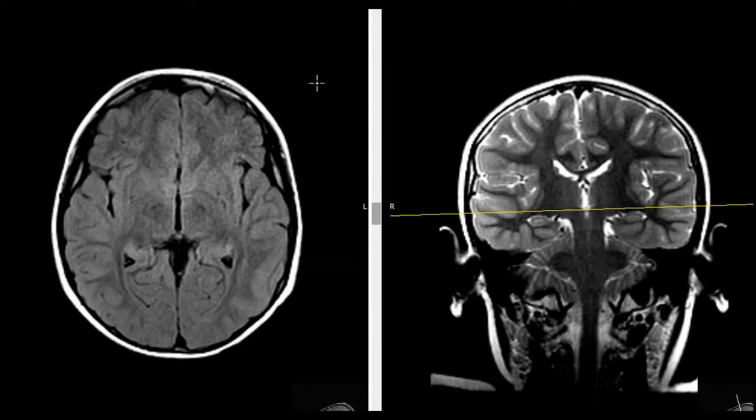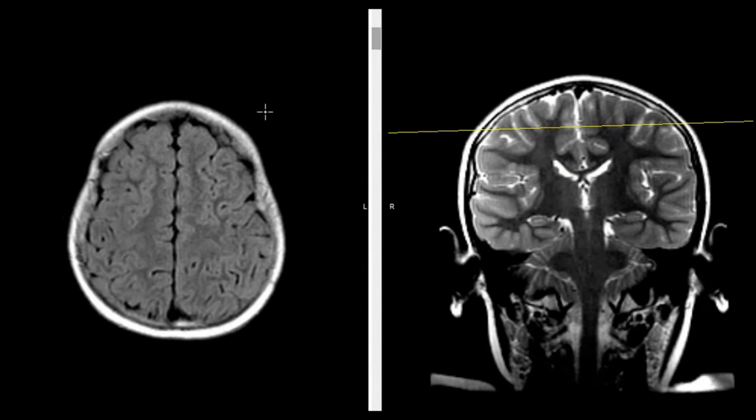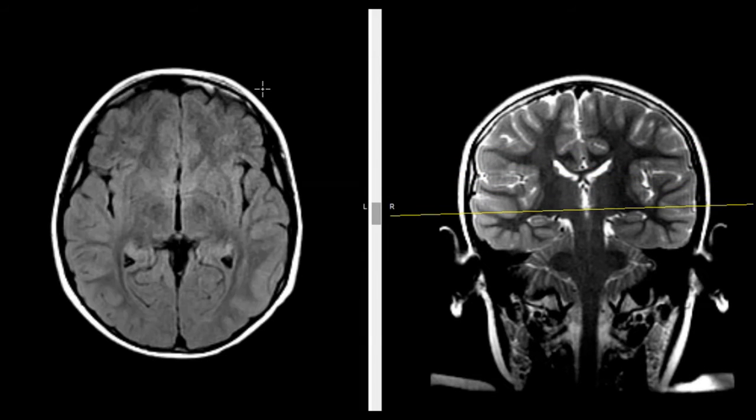This is a 9-year-old male who has a history of new onset of seizures. And so they did an MRI scan here to make sure there is no structural abnormality that would explain the seizures. Sometimes the brain is just completely normal, and sometimes there's a finding such as a tumor or infection that can cause that.